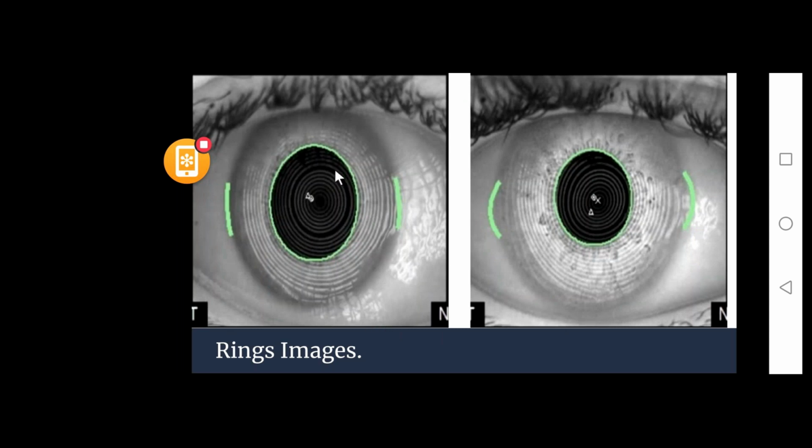Great. Thank you. So as you can see over here, as I was talking to you about the cone of focus, there are internal rings, there are external rings. There is a big space between the bundles of rings. Suppose this space wasn't present, there are chances that there will be an overlapping of these rings, and it can give you a false reading.